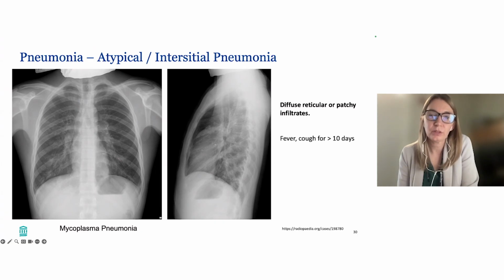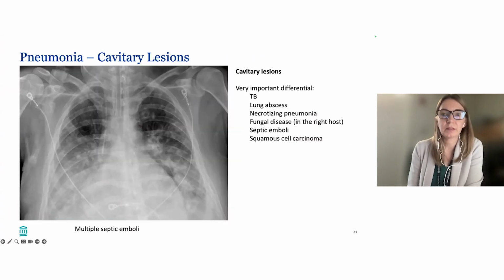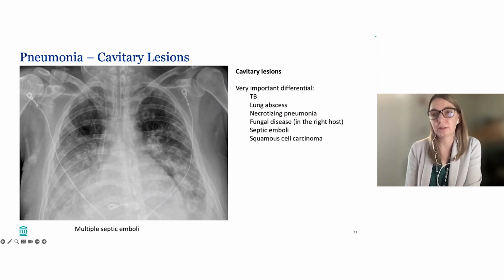If you get a question on the boards of someone who is overall not acutely ill, but has had low-grade fever and cough for greater than 10 days, with a chest X-ray with only mild abnormalities like this, think about mycoplasma. The board exam likes to quiz on cavitary lesions. There is a very important differential of cavitary lesions that includes TB, lung abscesses, necrotizing pneumonia, fungal disease in the right host, septic emboli, and squamous cell carcinoma, among others.